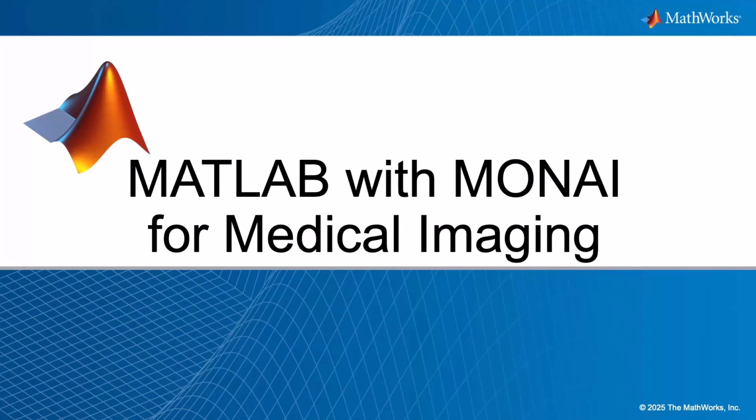Hello everyone. Today I will share with you a quick walkthrough of using a deep learning image segmentation model trained with MONAI within MATLAB using the Python interface. MONAI is a popular Python package which includes several tools for medical imaging. Let's jump right in.